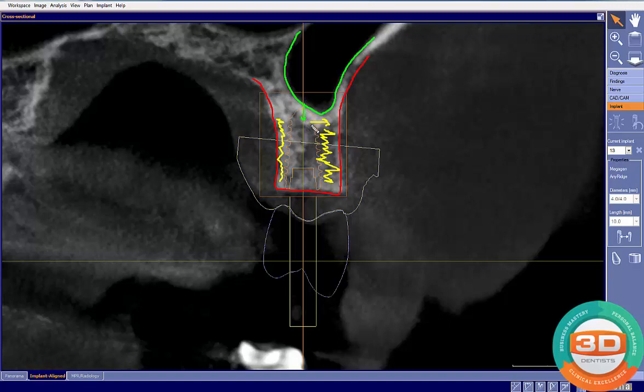Or two, we can continue with the implant sizing that we have and do a relatively straightforward sinus bump right here. Because that's where my guess is we'll have to do the sinus bump. Either option works. It's just a matter of the comfort level of the dentist prescribing this implant.